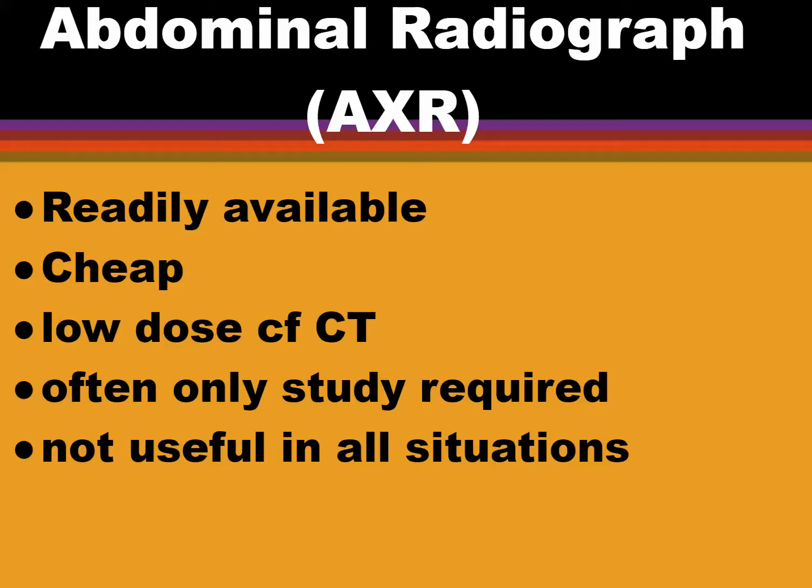Now we're going to talk about the abdominal X-ray or the abdominal radiograph, why we use it, where we use it, what are the indications, and I'm going to go through a few X-rays of abdominal pathology. So, why the abdominal X-ray?